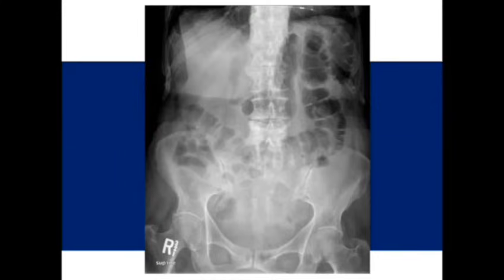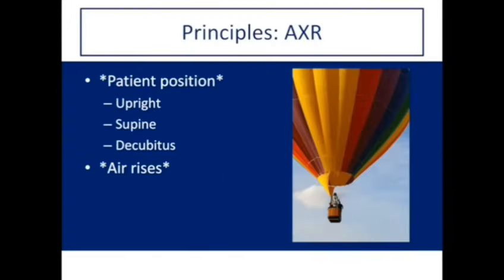So we'll start with this X-ray, and we'll start with a question. You're on call and a patient's X-ray comes up and you're being asked your opinion on this X-ray, and the question that they're asking you is, does this patient have free air in the abdomen? And you can pause this video and take a few seconds to take a closer look and then commit to an answer and resume the video. Okay, now that you have your answer, we'll come back to this X-ray in a second.